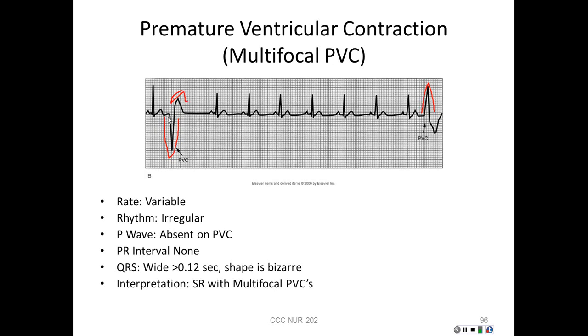So we've got the QRS complex on this one. It truly is a QRS complex because the first downward deflection is a Q. Or in this one, where really our first deflection is up, it's still called a QRS complex, but the T wave is here going in the opposite direction. So a wide, bizarre looking beat, where the QRS is going the opposite direction of the T wave, is what we see with a PVC.